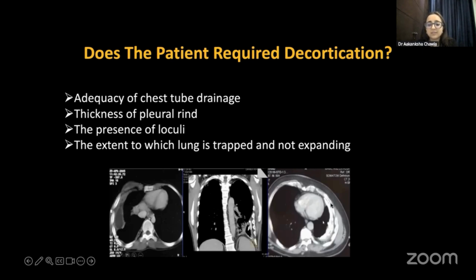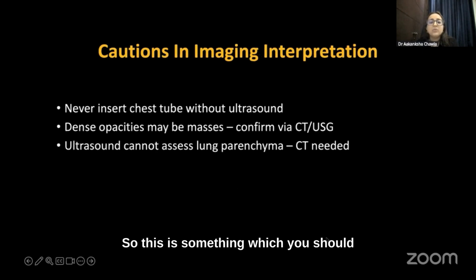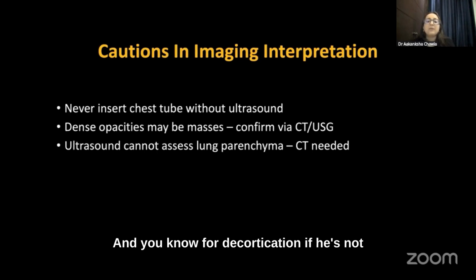If you can see here, this is something which you should consider in your patient of empyema, and for decortication if the lung is not expanding.